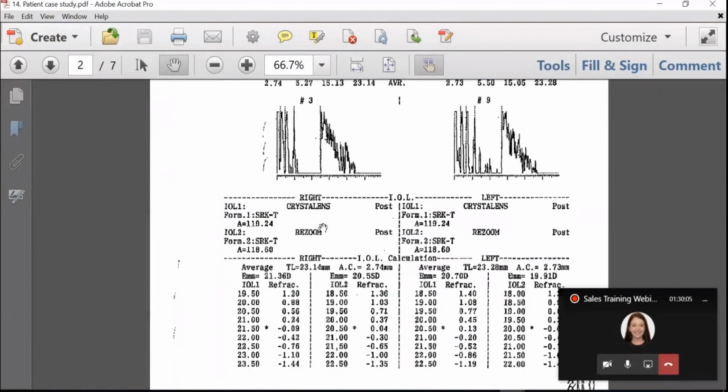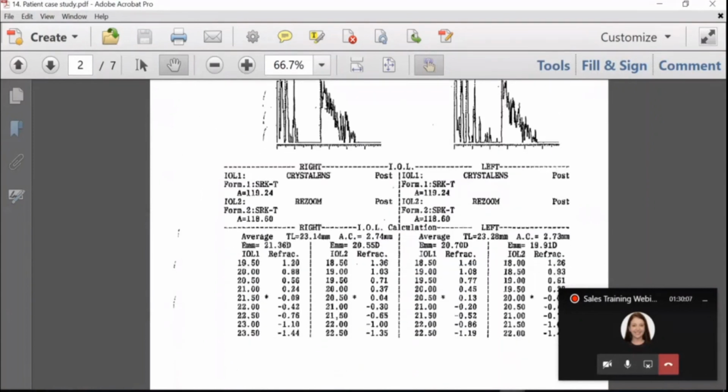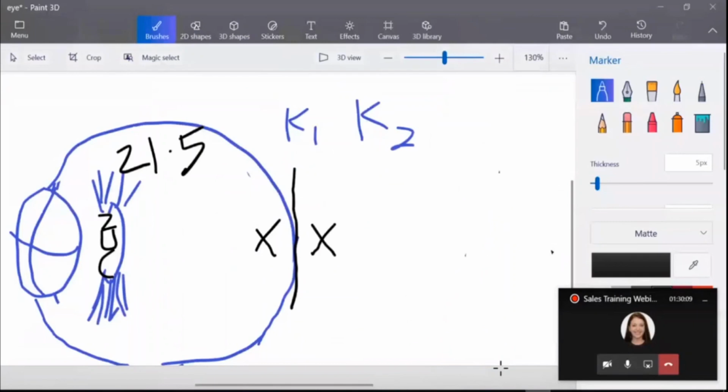So using the spherical equivalent power may not be perfect to correct the astigmatism, because this gap that you see here is 1.62 diopters. That gap is a little bit too much, and you won't get a very good, clear vision. All right, so what is needed is a toric lens to correct the astigmatism here.